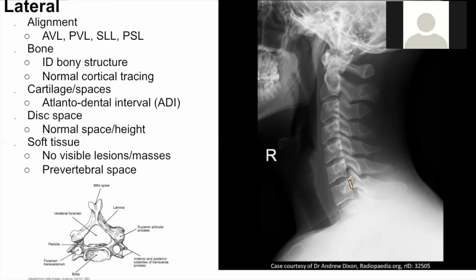So vertebral body, pedicle, and then next are the lateral masses, and these are the lateral masses. Sorry, I kind of drove over the pedicle a little bit, but that's the lateral mass. And the lateral mass articulates with the vertebrae above and below. So lateral mass here, and then the lamina, it's right here. And then the spinous process is right here.